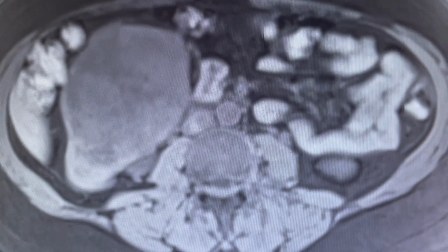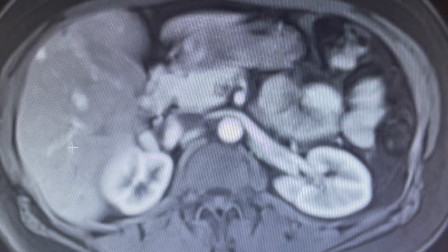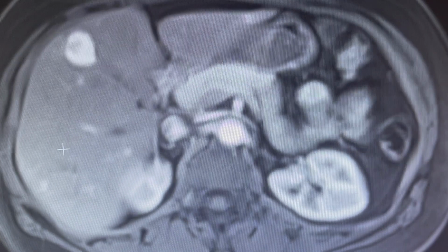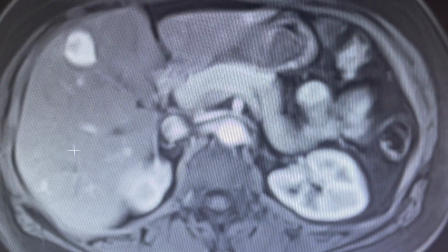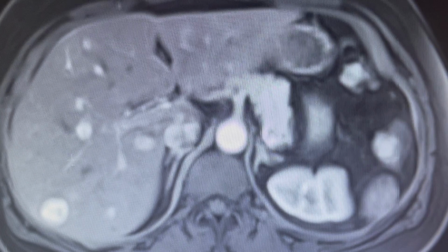Now, the next set of images are what I call arterial dominant phase imaging, with contrast in portal veins and prior to contrast present in hepatic veins, which these are the hepatic veins right here, which is the most important set of images, and this tells us about the arterial flow to various lesions.